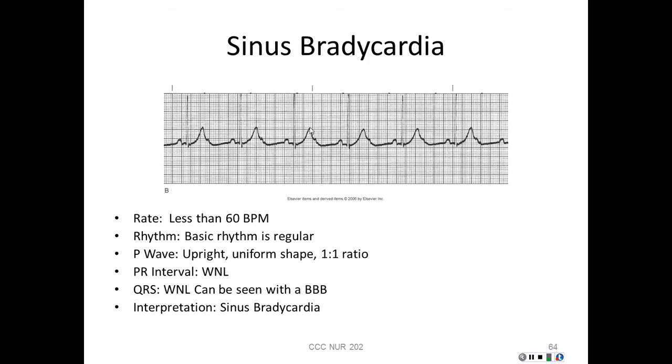So we know from here to here is 6 seconds. So from here to here is 6 seconds. Then we count 1, 2, 3, 4, 5. Our heart rate is 50.